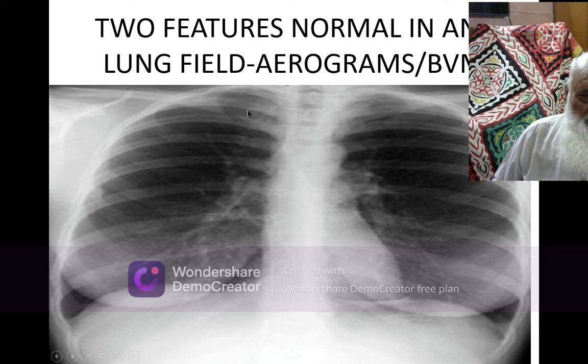apices of the lungs, the supraclavicular fossa. There is no bronchovascular marking in normal sitting posture. Very slight bronchovascular markings are seen in these zones. Very, very thin. It's no problem. They are not crossing even. So this is how I interpreted it.